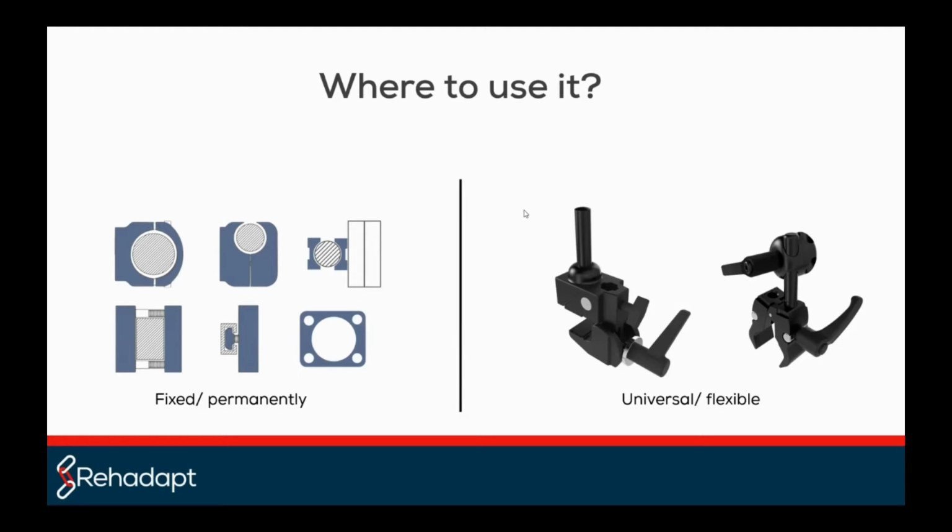These table clamps are perfect for tables, and a fixed permanent installation is also important and better for an installation on a wheelchair. Because in these situations, your customer only wants to use their mounting arm, they want to have their mounting arm inserted into the wheelchair, attach their communication system, have the opportunity to swing it away when they want to leave the wheelchair, or leave it and move it back into the operating position where the customer can use their tools.